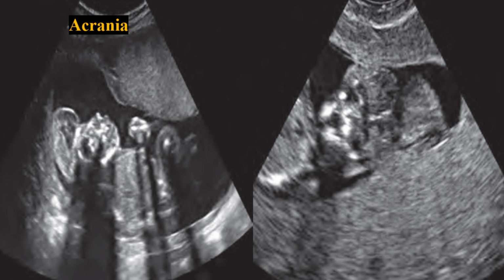And now we are going to discuss another brain anomaly, which is acrania. Acrania is the presence of a large amount of dysmorphic tissue resembling the brain above the orbits in the absence of calvarium, skin, and normal brain. As with anencephaly, acrania is considered lethal. When the soft tissue extends laterally above the orbits, the configuration of the craniofacial structures in the coronal plane has been likened to a Mickey Mouse sign.